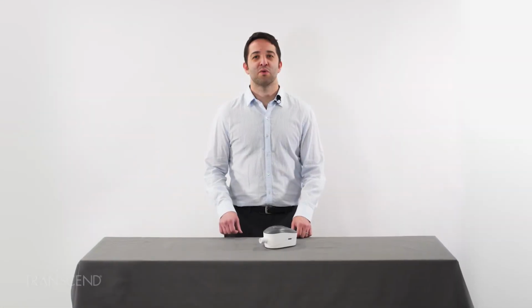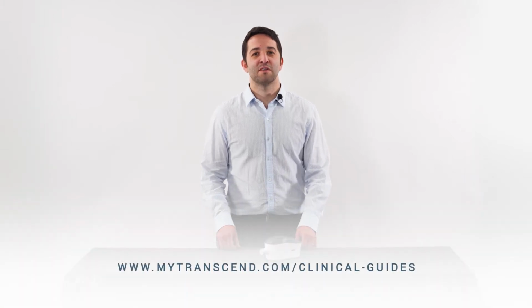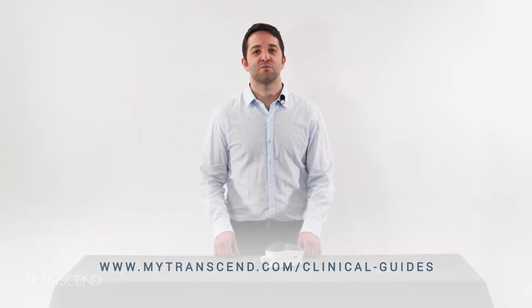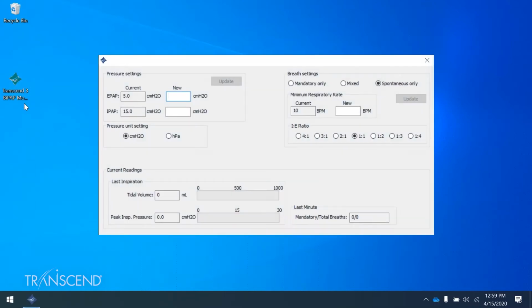This guide will provide a quick overview to show you how to program the Transcend 3 BiPAP with the BiPAP programming software. Begin by downloading the software at the URL below. Note that this program only works on Windows operating systems. Once the download is complete, look for the icon on your computer and open the program to begin.